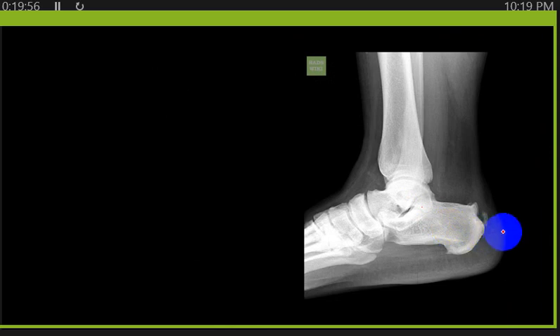Also, this is another patient here with tendinopathy, with calcification, and deformity here. And here you see the dampness of the fat in Kager's fat, compared with the upper part. This is the soleus muscle here, and you see the fat here is clear, and the fat here is not clear. So we have 3 components of Haglund deformity or disease or syndrome.